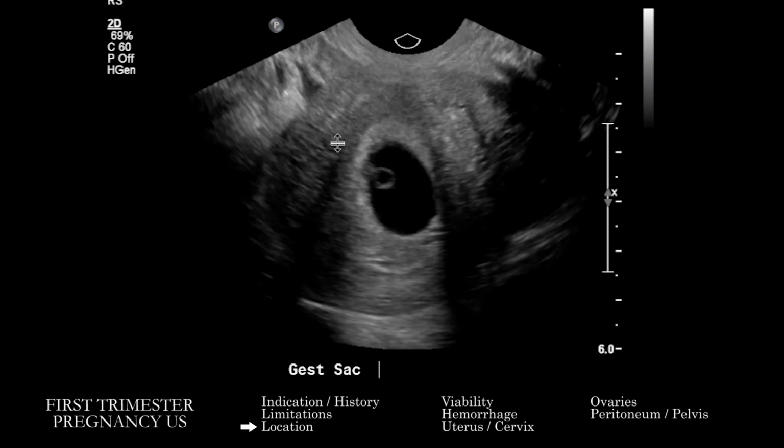And then if we don't see an intrauterine pregnancy, we have to be careful about just fluid in the endometrium. If we're not seeing a clear yolk sac or these other additional signs, are we localizing a potential cystic structure near an ectopic location, even cervical, an interstitial pregnancy? Are we seeing the adnexa intra-abdominally?